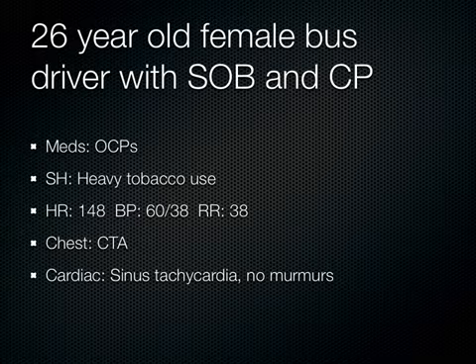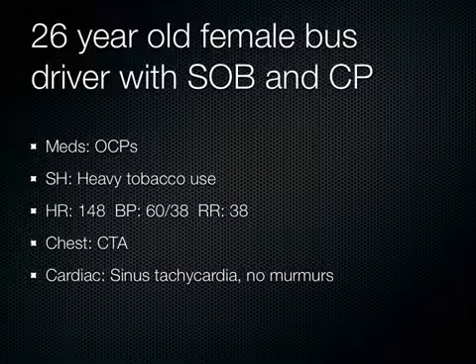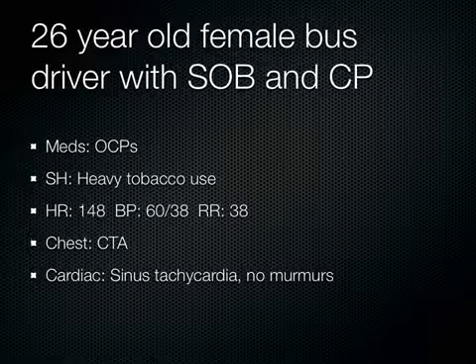Okay. So can you put someone like this in the CT scanner? You could, but... Have the medical students seen this too? No. Oh, good. Okay. So what does a PE look like on ultrasound?